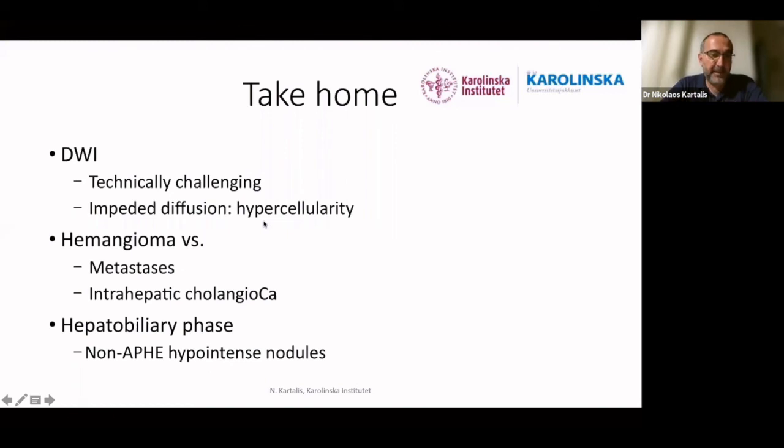And finally, for the patients with HCC, the hepatobiliary phase hypointense nodules without arterial phase hyperenhancement are nodules that we need to keep an eye on, because these may likely turn to HCCs in the near future.